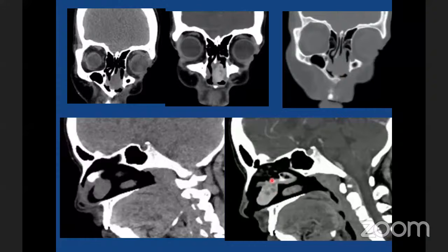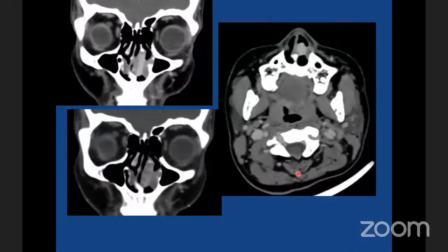The sagittal images shows that the lesion is arising from the middle turbinate and abutting the inferior turbinate. So actually you are not able to see the middle and inferior turbinate anatomy very well on the anterior aspect of the turbinate or nasal cavity. And on sagittal images, you will see the lesion arising from the middle turbinate undersurface, and this is the inferior turbinate. So point here I am trying to tell you is always look at the sagittal image. You tend to look only at the coronal and at the most axial, but definitely look at the sagittal image, which will give you an idea where the lesion is arising from.